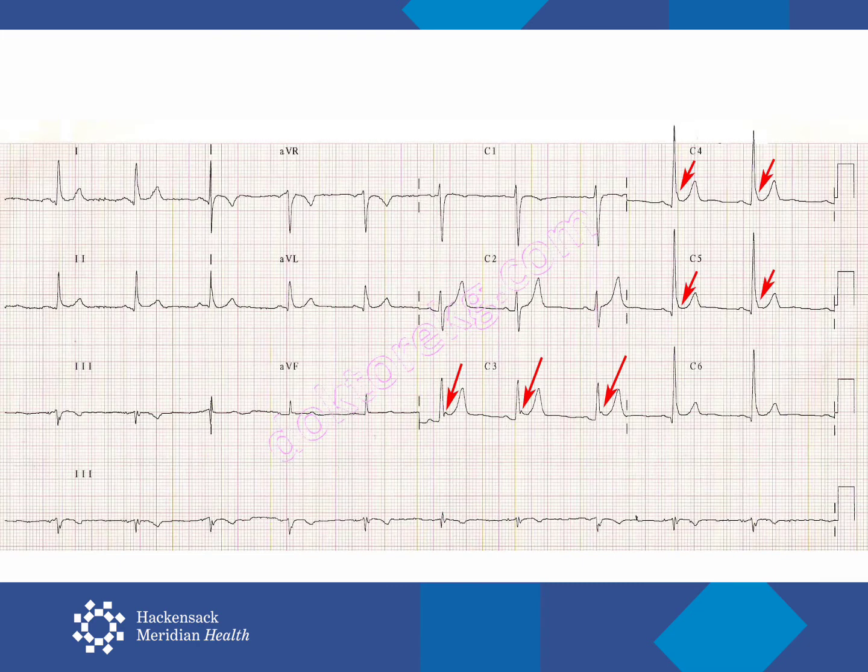These are typical examples of benign J-point elevation in a young man. Slight J-point elevation, somewhat smiley face, quote-unquote, concave upward ST segment. This is not a myocardial infarction.